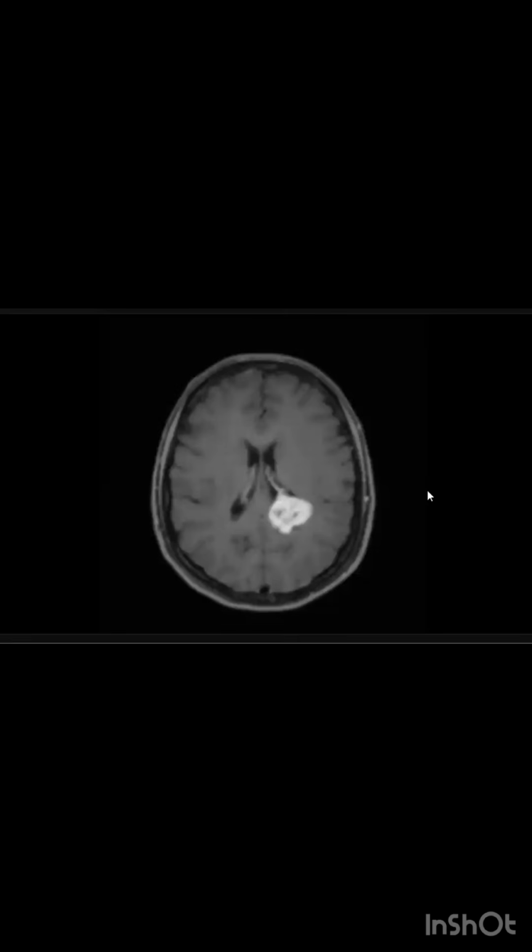My first diagnosis will be that this is maybe meningioma. The other will be choroid plexus papilloma, but it is less likely. My management: this is an urgent case. I will alert the report as a 2-week wait referral for the neurosurgical team. This patient needs to be discussed in the neuro MDT. There is no hydrocephalic change, so there is no urgency to call the team. But the patient needs imaging of the whole neural axis to rule out any associated lesions.